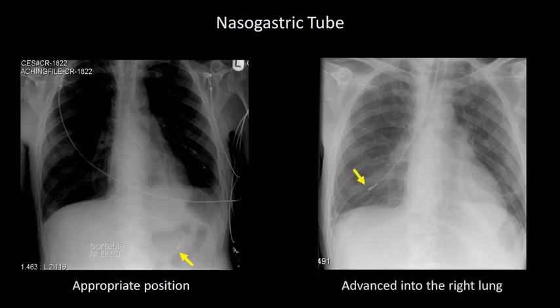While this can create airway resistance and can lead to immediate respiratory difficulties, the greater risk is performing gastric lavage, or worse, inadvertently starting tube feeds on this patient. 20 to 30 cc's of Jevity or Ensure into this patient's lungs may be all that is necessary to trigger a horrible aspiration pneumonitis or full-blown ARDS. Always check a newly placed NG tube's position via X-ray.